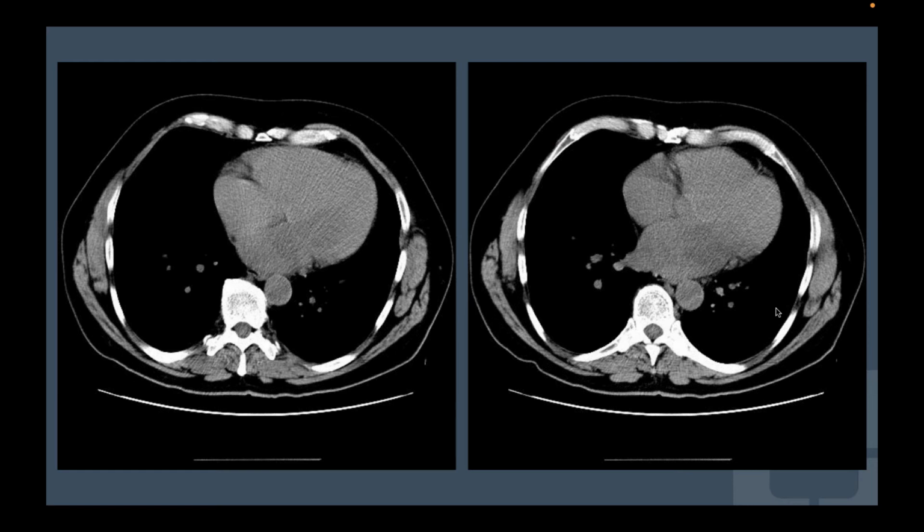I think for something like that, honestly, this is what I would do. First thing I would do is produce a thicker section MPR image. So if I'm looking at something like a 0.6 or 1 millimeter cut, I would actually make a 5 millimeter cut, because for large objects that have just a very small variation in Hounsfield unit attenuation, you make a thick slab and you can more confidently know that you're seeing a finding. So that would be the first thing I would do. And if it persists, then I would probably recommend a contrast enhanced exam with triggering off the left atrium. If there was some reason they thought this person had a mass or a thrombus, or there was some echo out there, then I would proceed to a cardiac MRI.